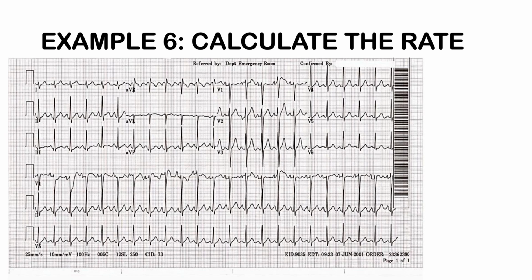What about this one? Again, pause the video to calculate and see for yourself. And whenever you're calculating these rates, make sure you use points that are very clear and the ones that are easy for you to follow. It's best to use the rhythm strip. Okay, you have your answer.